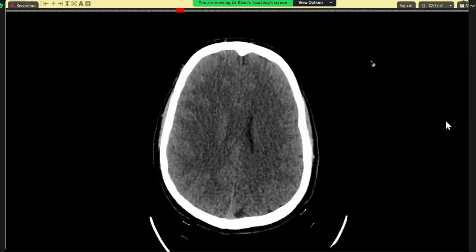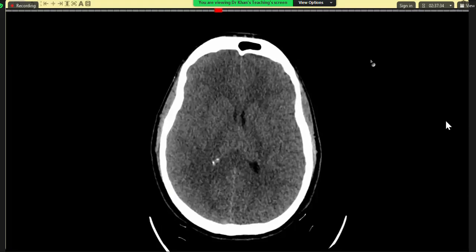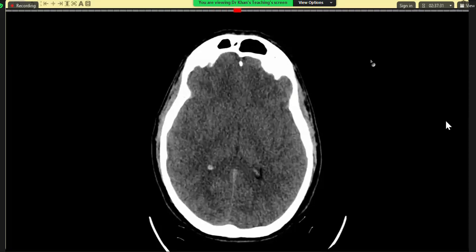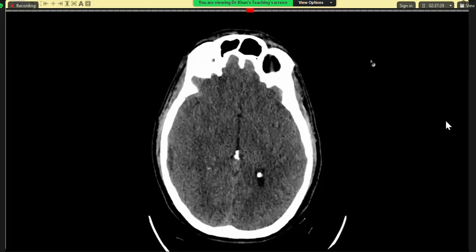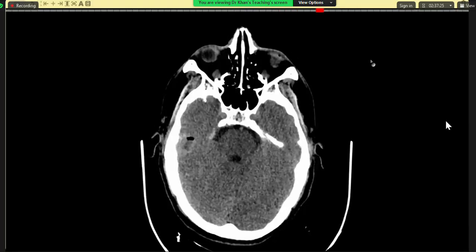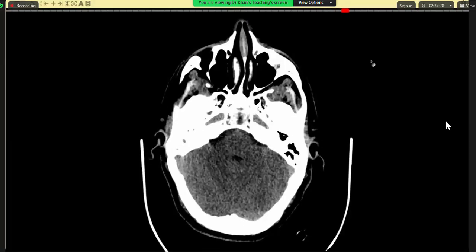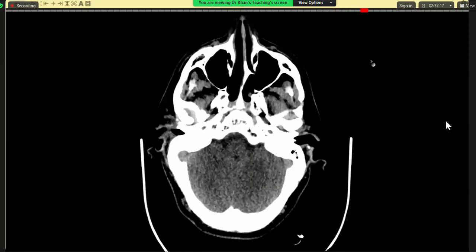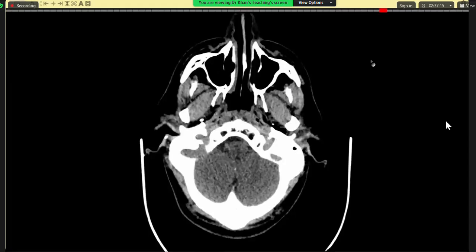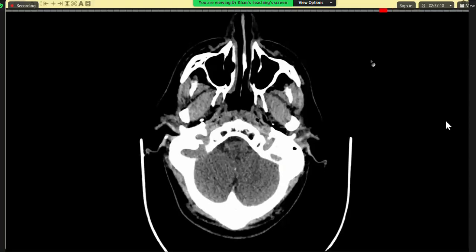contrast enhanced study, and also there is some loss of insular cortex, which is also looking abnormal. So, sir, I will advise MRI with contrast for the patient to see any adjacent transverse sinus, which is also hyperdense on the right side. So I would like to advise MRI with contrast for this patient to rule out sigmoid and transverse sinus thrombosis with associated abscess. Sir, this is 2 o'clock in the morning.